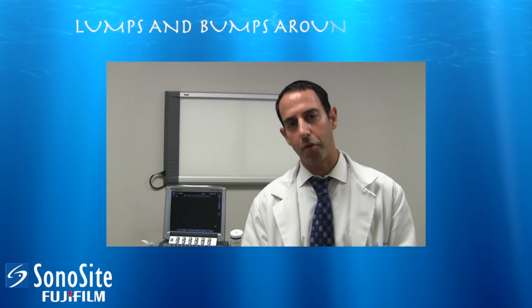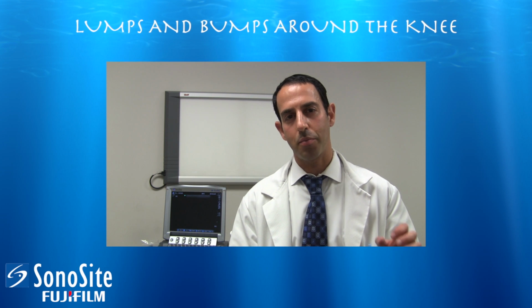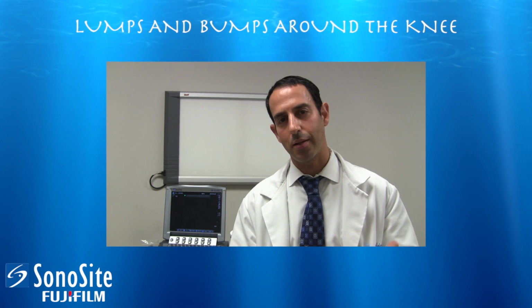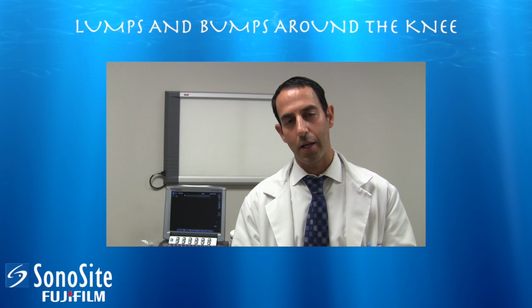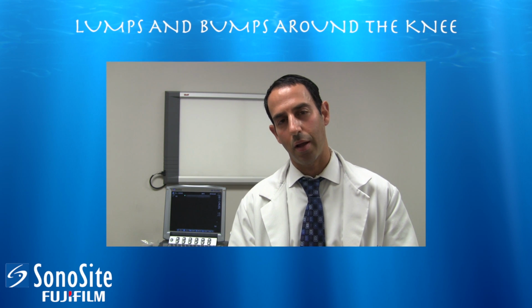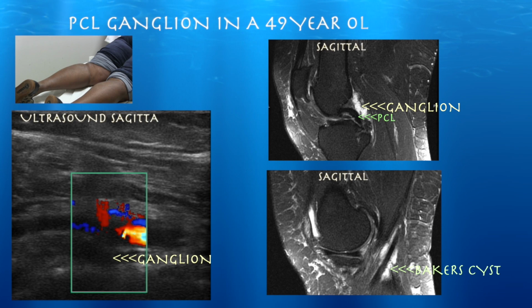This next case is of a lady with a ganglion cyst just posterior to the PCL. It's important not to mistake this for a Baker cyst. It does not lie between the tendons of the medial gastrocnemius muscle and the semimembranosus muscle. On exam, she did have some pain on palpation in this region, and essentially I just reassured her it's just a simple cyst. It's a 49-year-old female, with pain in her left knee for about a year.